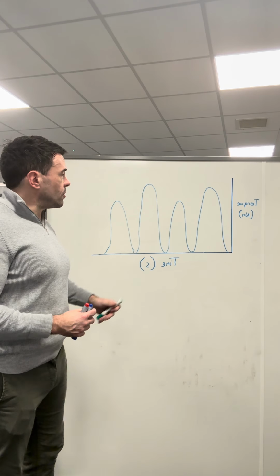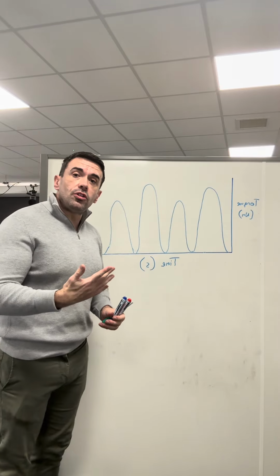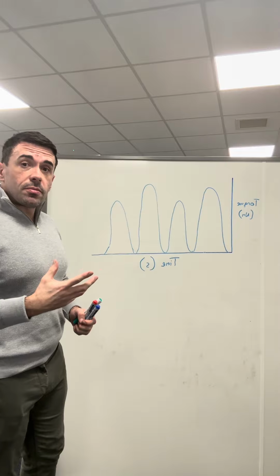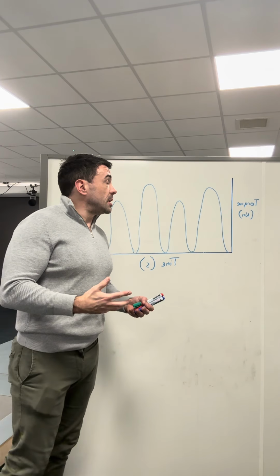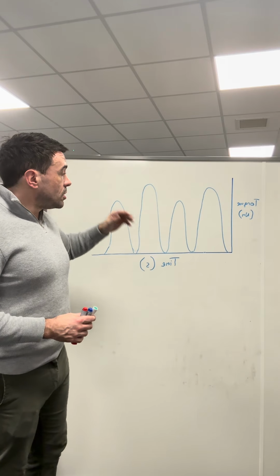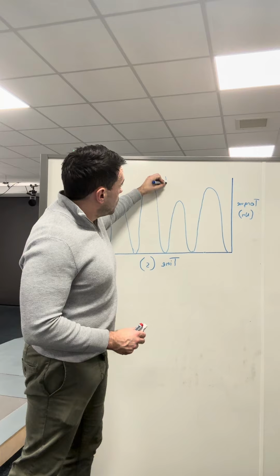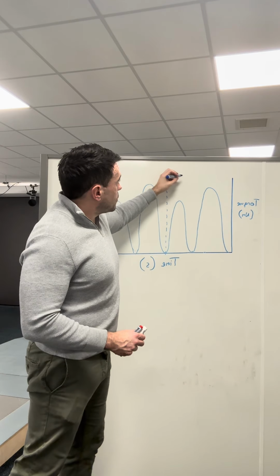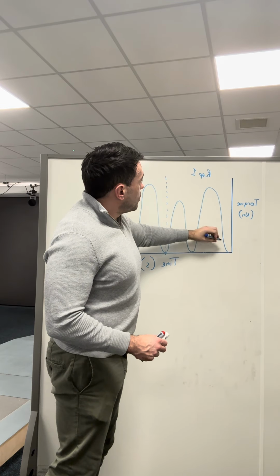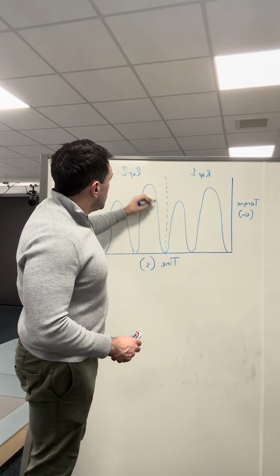So typically you'll see a graph that looks something like this, with no distinguishing features between the peaks other than what you know that you've tested. When you're testing agonist and antagonist muscle groups, you have the larger muscle group, in this case quadriceps and hamstrings. The quadriceps should be the strongest muscle group. Here we've done 2 repetitions. Our first repetition is here. This would be rep 1, so knee extension, knee flexion, and repetition 2, knee extension, knee flexion.